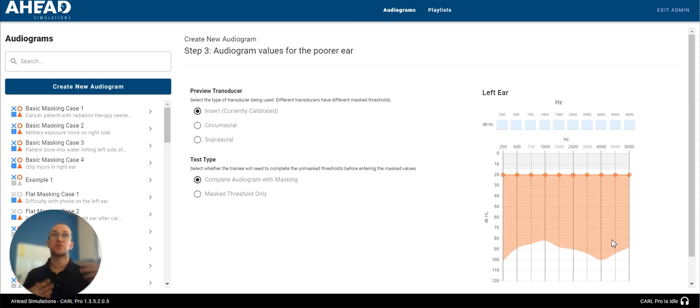That is because the training standards are made to be a conservative estimate to make sure that you are masking mainly more than you need to make sure you're getting the correct thresholds for the patient. Also, interaural attenuation varies person to person and human to human. And so those values are taken into account to cover the variance that you'll see inside of clinic.